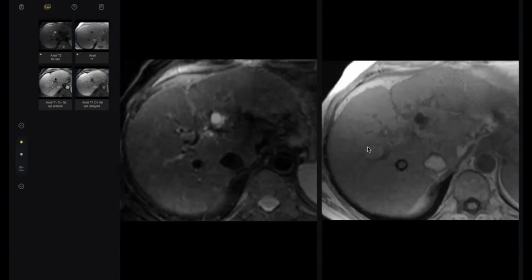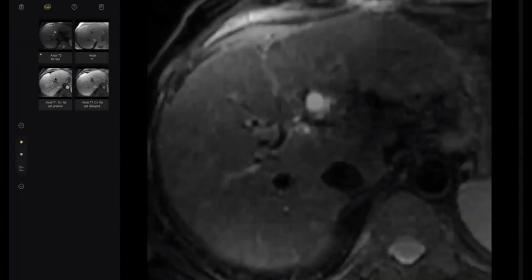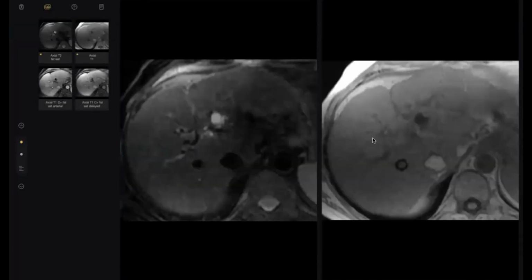One second. It is hypointense on T1 and hyperintense on T2 weighted imaging. What is around it? There is a retraction and there is architectural distortion. Doctor, what is the surrounding hypointense signal here? What do you think? It is causing abutting and displacement of the vessels.